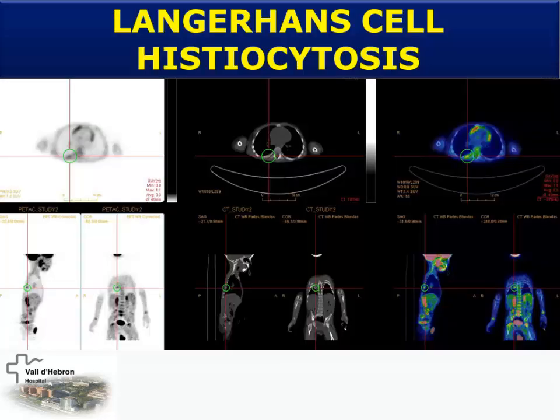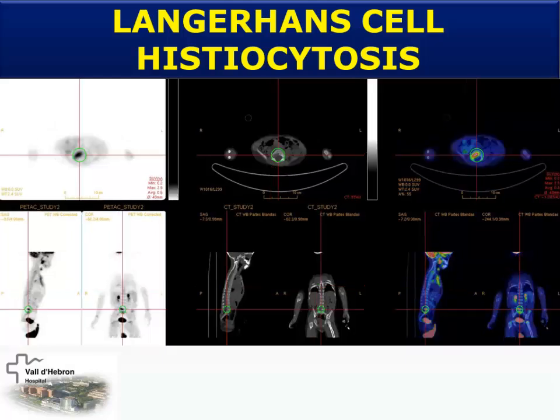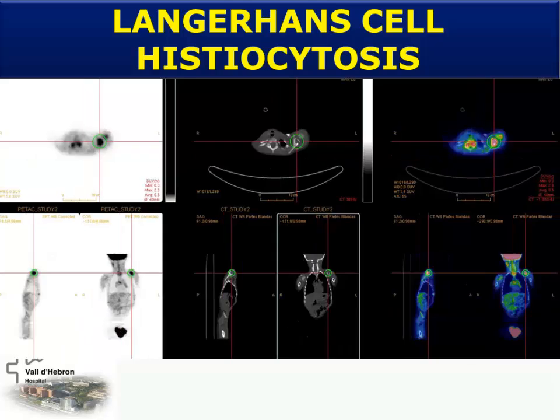One case of Langerhans cell histiocytosis. The PET with FDG is an all-in-one exploration again. If you perform an FDG, we can detect very easily the whole extension of the lesions, as in this boy with multiple involved vertebrae, femur, etc. Here, here on the thorax also. Here a vertebra, and here a big lesion on the scapula. Okay.